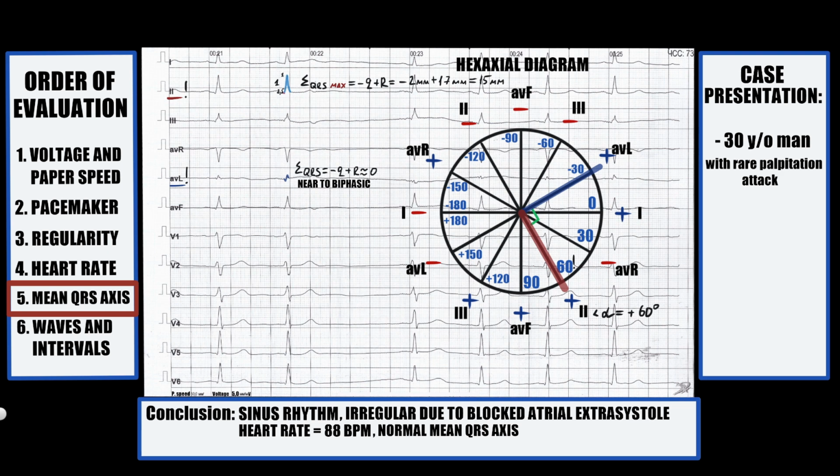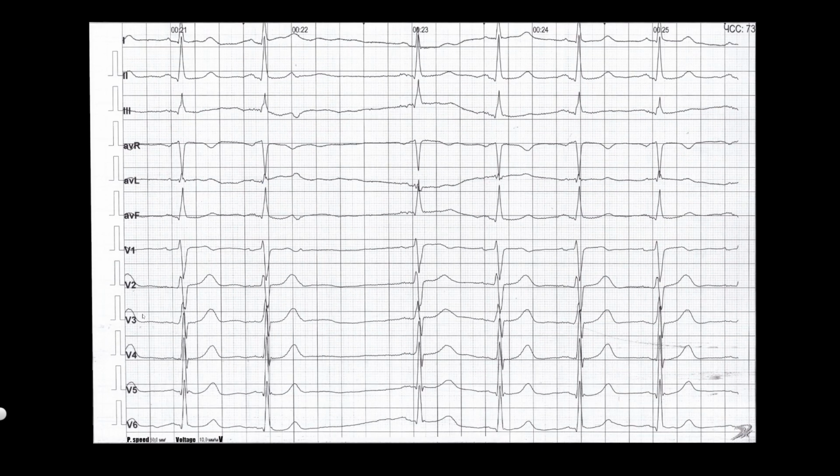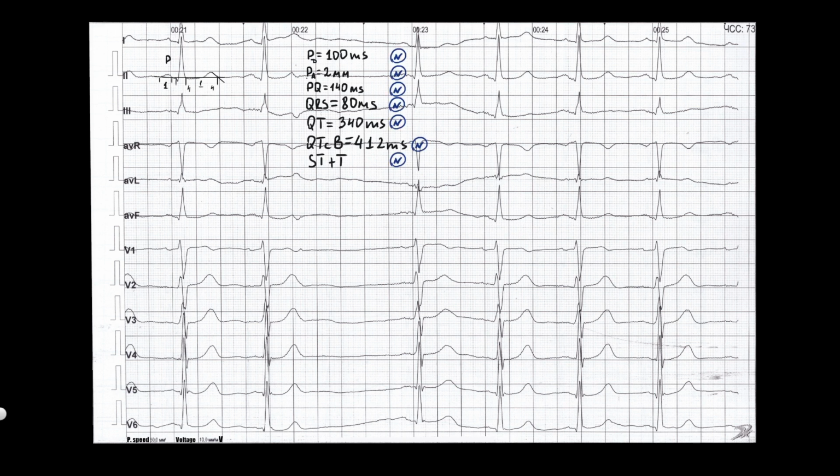Next step is one-by-one evaluation of all waves and segments. All waves and segments are in normal range, so to save your time I will add the results of the measurements according to the second standard lead. If you need to check in detail, press pause.